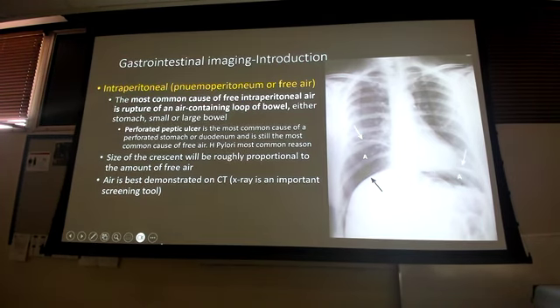All right. Intraperitoneal. Well, let's look at it. So this one, you can actually see the free air under the diaphragm on both sides. This thin, white, radio-opaque line is my diaphragm. That's my liver. That's all air. That should not be there. Same thing. Thin, white, radio-opaque line is the diaphragm. This here is actually the stomach and the gastric bubble. So in this case, you can actually see air on both sides, but I have air beneath the diaphragm.